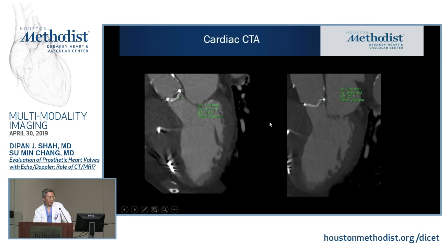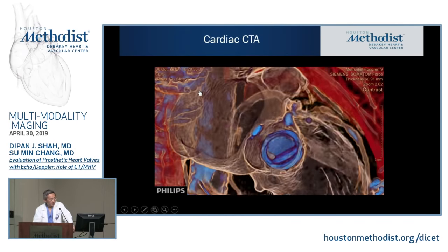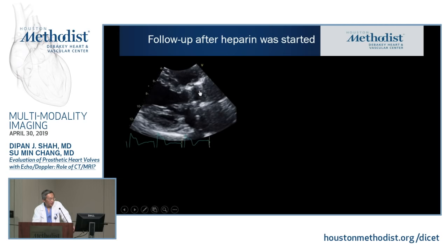So Dr. Mimir actually read this one, and as you're not surprised, he got it right. He thinks there's a clot and there's a pannus. We don't, this is just pretty, so I have to put it there. Okay, I don't know why.